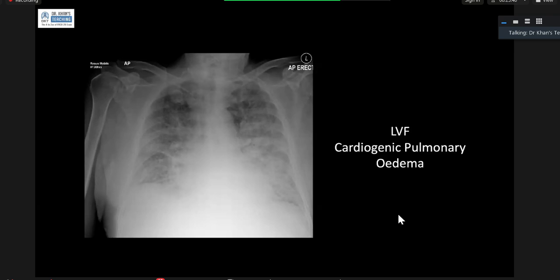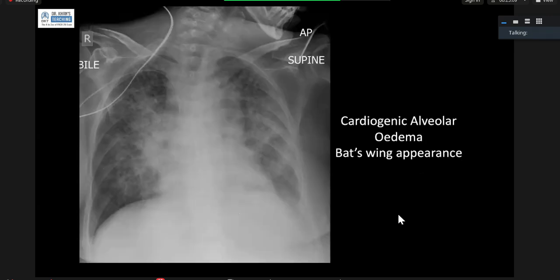So there has to be a conversation between the clinicians to see what the clinical picture is like, and then you give importance, okay, this is more likely pulmonary edema. Or if the patient has suddenly presented with an infective episode, you can say there probably are areas of consolidation. You can't actually say. These are the limitations that we face when we have complex X-rays, especially for ITU patients, who may have multiple pathologies at the same time, okay? This is again another case of alveolar edema, okay? You don't have any interstitial pattern here. This is alveolar edema, ill-defined spreading edema, right?